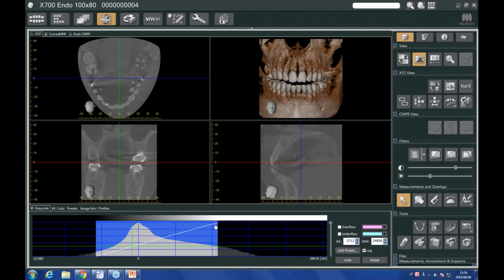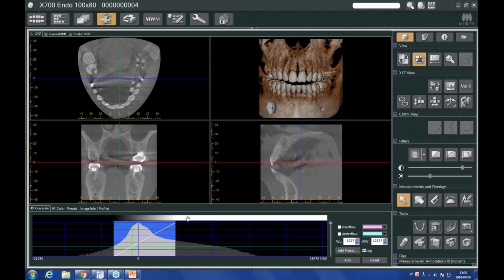And from that point, they grab this white line here, this angled line, and they simply pull it up until it has the detail level they want. Okay. Now, this can be shifted forward or back by simply clicking on the vertical line. And for my particular monitor, I'm going to put it about here because that's what I like. Again, your monitor will be a little bit different.